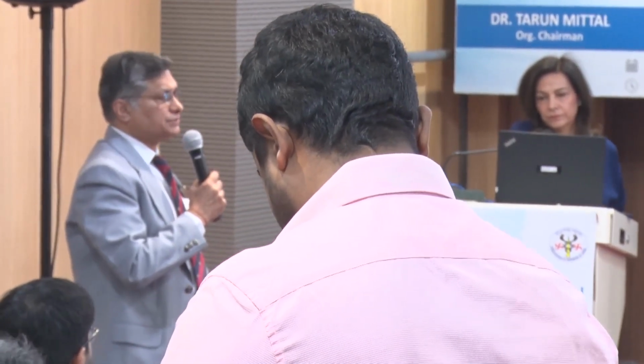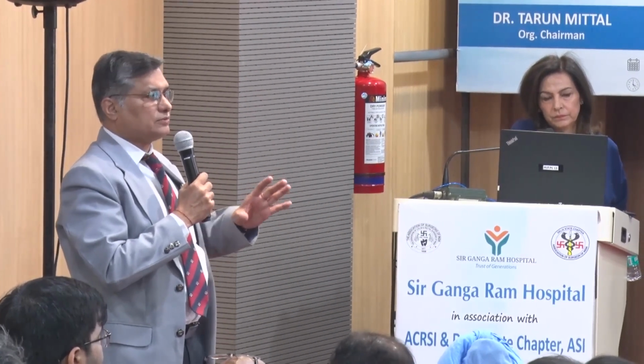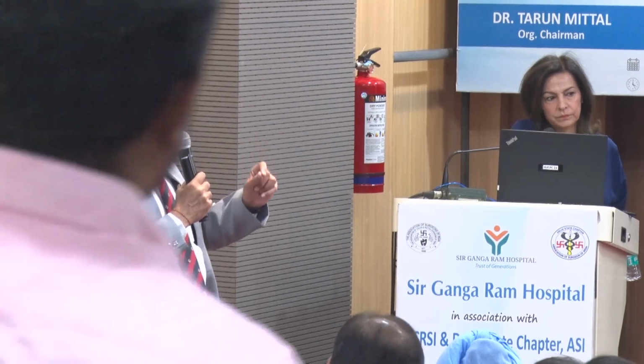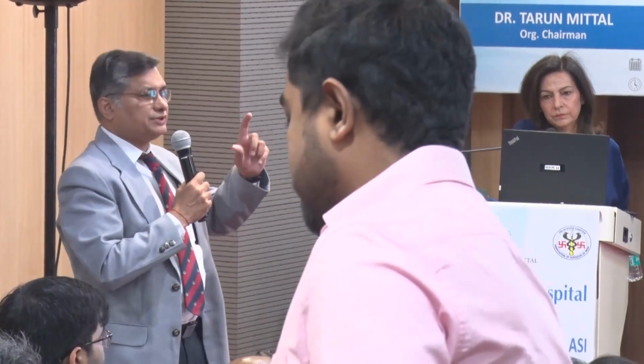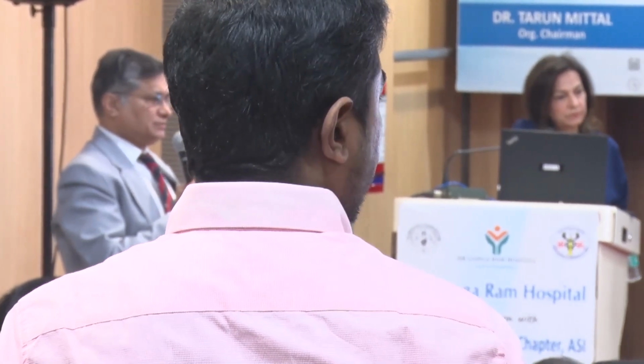I have two comments. One thing is that there is an excellent article in DCR which has said that in 40 to 50% of the cases after MRI, your plan of treatment is going to change because you might diagnose undetected abscess, you might detect secondary tracts, so that is why your plan might change. So that is why after I read that article, I have started doing MRI for all my patients unless it's a subcutaneous or submucous fistula, which I can palpate easily. That's one comment. One more comment, please.